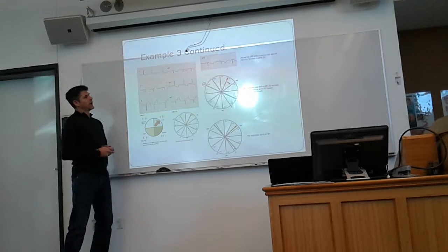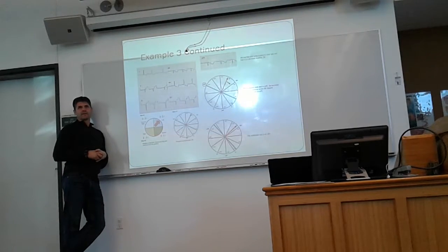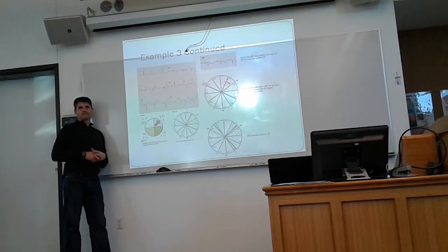So most appropriately, I would argue this would be almost right at negative 45. Probably negative 46 or 47 would be the perfect answer, because that makes AVR slightly more biphasic than lead 2 by a degree or 2.